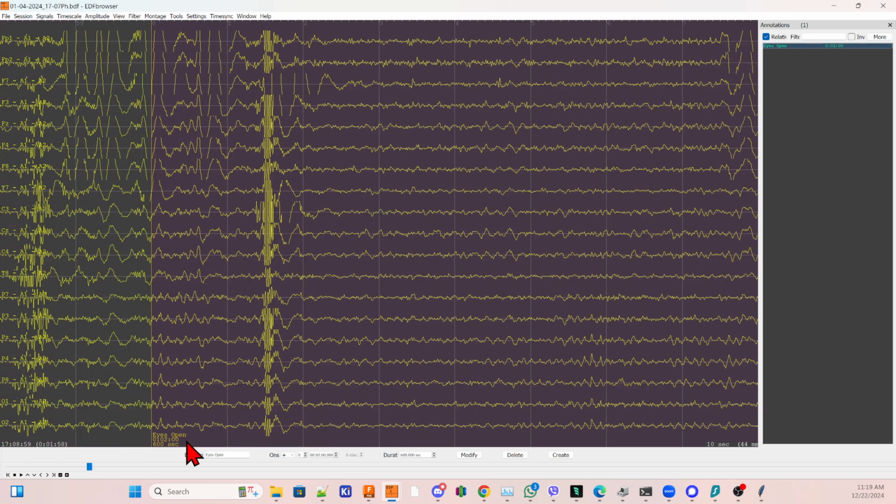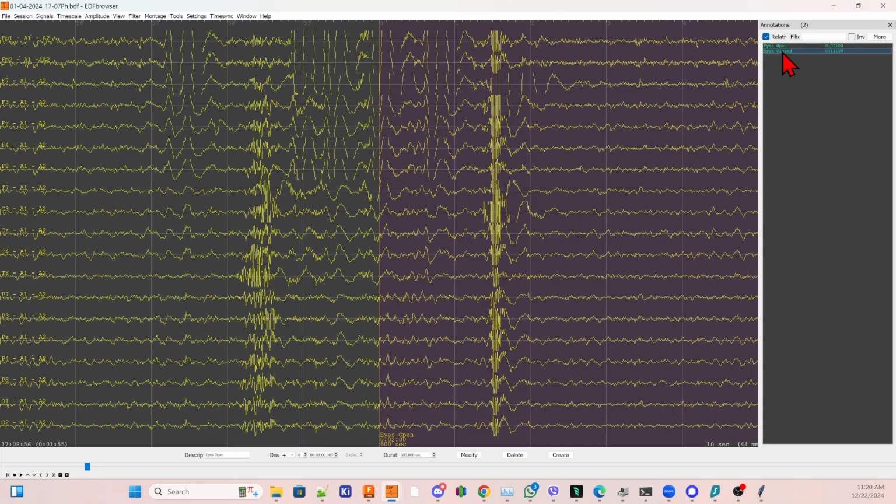Okay, good. So then the next period is the eyes closed period. And according to my description, that started at 13 minutes. So I'm going to type 13 over here. I hope you can see what I'm doing here. And then the duration was actually a little bit shorter. It was 9 minutes 45 seconds. So that is 585 seconds. And create. Good. So now we have eyes open and eyes closed.